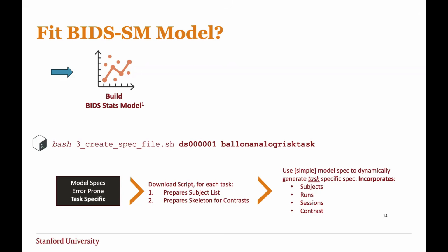And then, of course, most people are probably not just interested in a one sample t-test. So you might want to model a group model, and I might try to see if I can modify it so I can dynamically create, say, two group ANOVAs, etc., rather than the current format. But because it requires transformations that you need to do, those are just necessary. So it takes you probably 70% of the way, reducing errors when you create these JSON files manually, but you still need the 20 to 30% to finalize them.